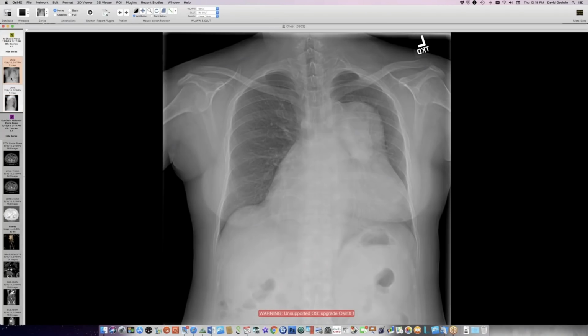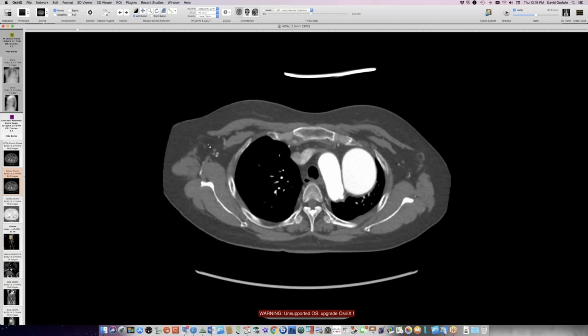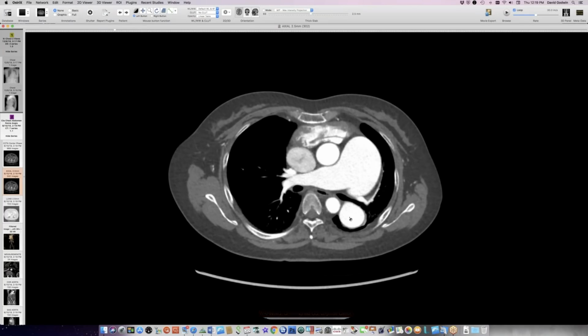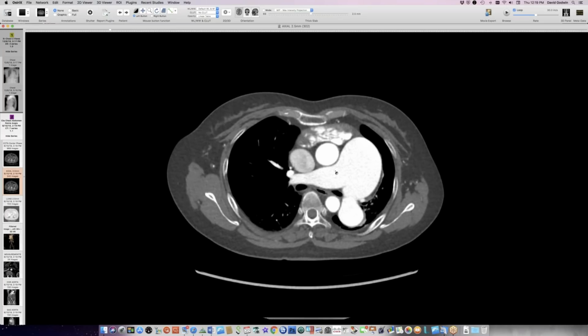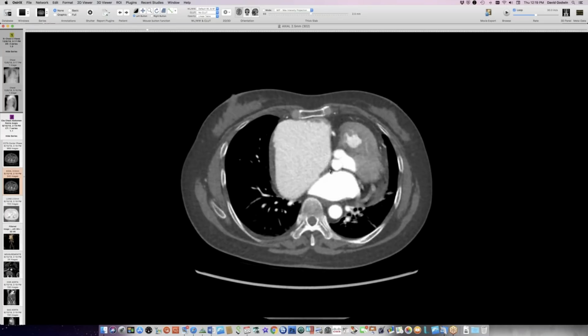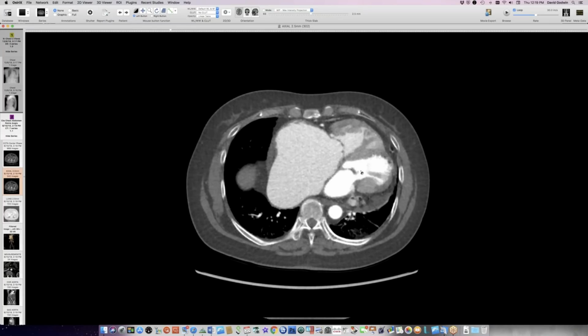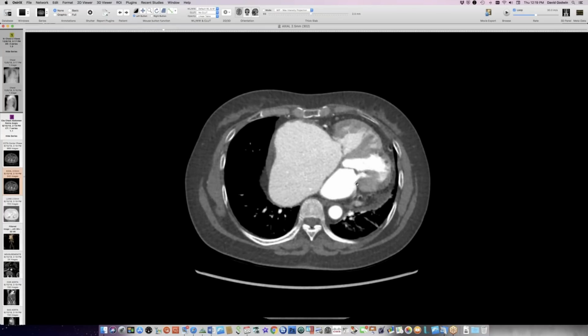So this woman, she has a history. She's from the Philippines. She's not had any treatment, but she has a history of coarctation of the aorta and also rheumatic heart disease. So that's the history we're dealing with. She did get a CT scan, and she indeed has a huge main pulmonary artery, and the enlargement extends into the left pulmonary artery. Right pulmonary artery is modestly enlarged proximally, she's got a very large right atrium and right ventricle, and she has mitral stenosis here.